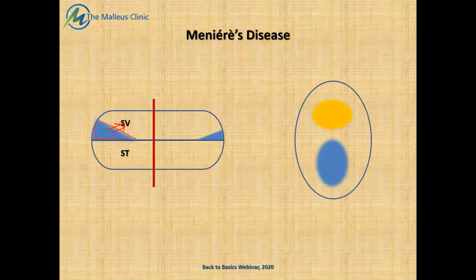Here, what we find is that the saccule has enlarged, the utricle has enlarged, but still the area is less than 50%. It's beyond 30%, but less than 50%. Some even consider their confluence as a grade 1, which is by Barath and by Bernard, right?